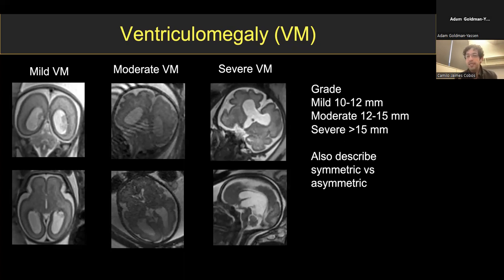One thing that I would point out that I think is fairly important is that in fetuses that have severe ventriculomegaly and there are abnormalities in CSF dynamics, it's quite frequent to have this phenomenon occur. The septum pellucidum disappears, it gets resorbed. I don't know what happens to it. I think it dies because it's too thin, and if the pressure is elevated, it just gets resorbed. But the reason I'm pointing it out is because I see these very, very frequently, and it will result in this picture. No septum pellucidum, the fornix is drooping down, and then people go into the realm of septo-optic dysplasia.